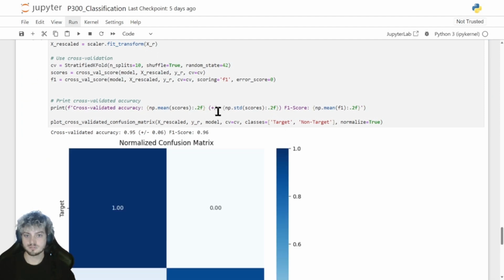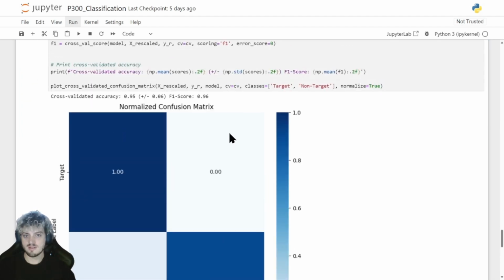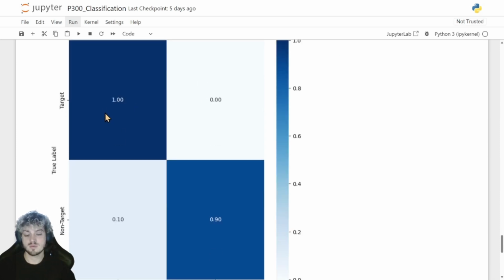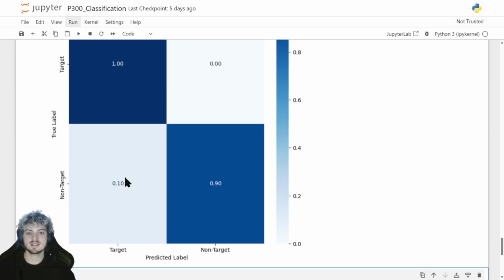All right, so I think I'm pretty happy with this. We have a 95% of accuracy. Variance is the lowest you obtain so far, or very close to maybe the non-oversampled example, but we have an F1 score that is very close to 1, right? So that means that we don't have any more false negatives again, but we do have some false positives, but way less than what we had before. I think this is totally acceptable for a real-time application.